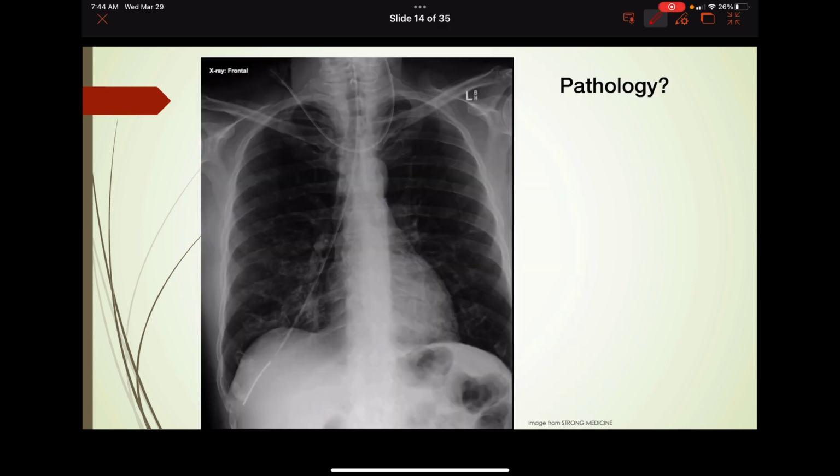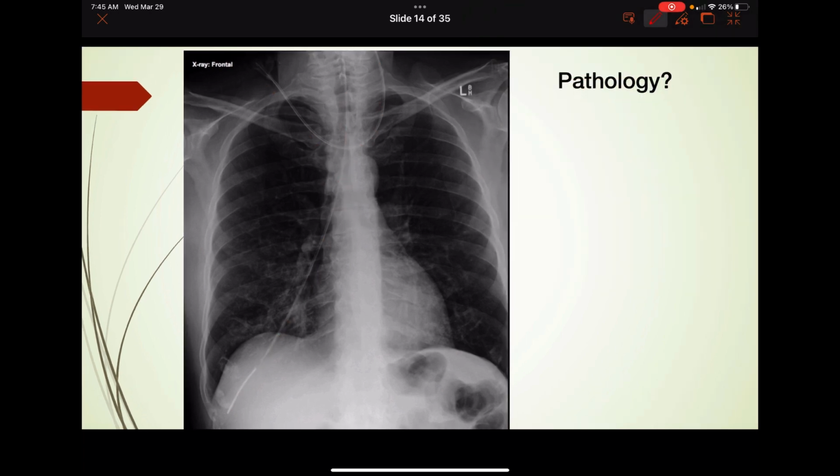All right, here is a chest x-ray. A for airways, come down here, look at the carina is right about there. And I see something, a line here coming down here that appears to be in the trachea, and then goes down into the right lung. So it looks like that's an NG tube that's misplaced. Looks like they have it in the trachea instead of the esophagus. This here is just an oxygen tubing here, so you can ignore that. But this line obviously is not good. They did a good job getting that way down in that lung, though. I'm not quite sure how, but kudos to them for effort.